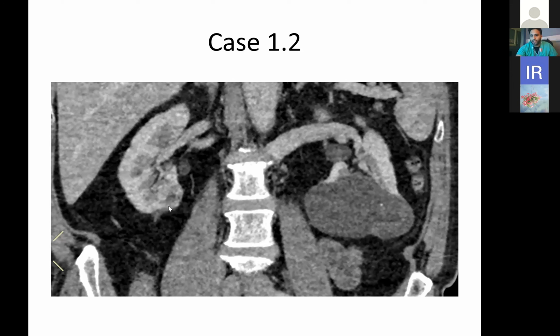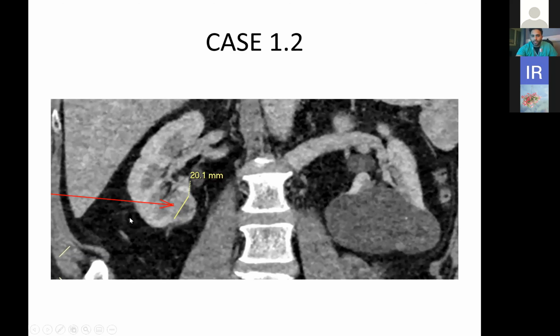So versus a solid lesion here. So this isn't necessarily cystic. There's no cystic components to it. There's a bit more soft tissue elements to this, obviously because it's a renal lesion, as you can see there. So yeah, I think it's certainly quite different on CT with regards to what is solid and what is cystic. Does that answer your question?